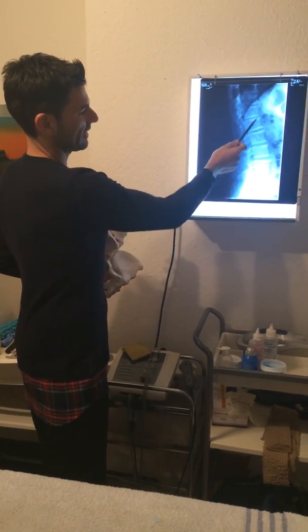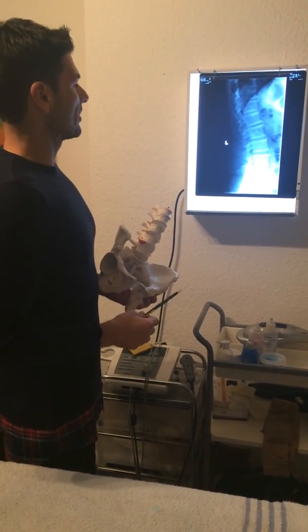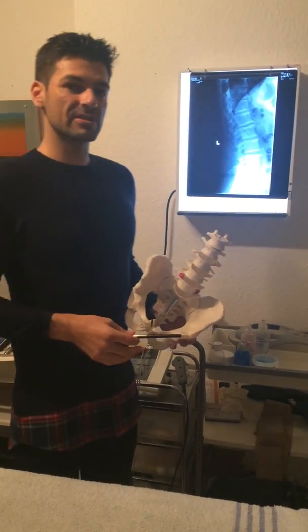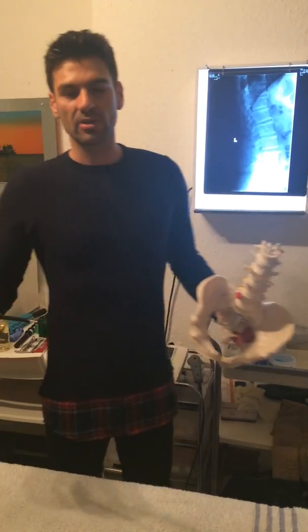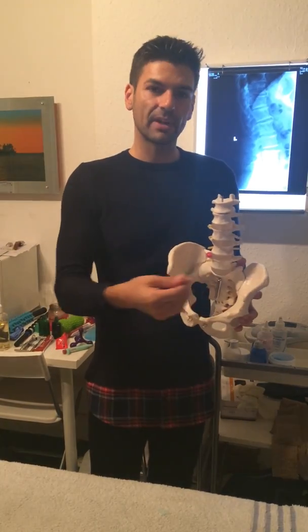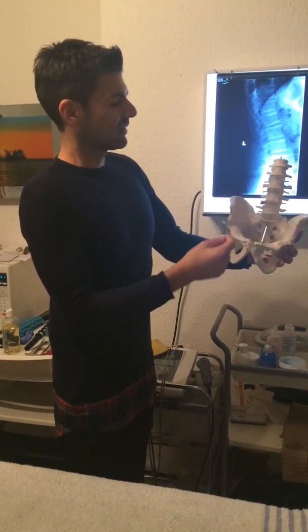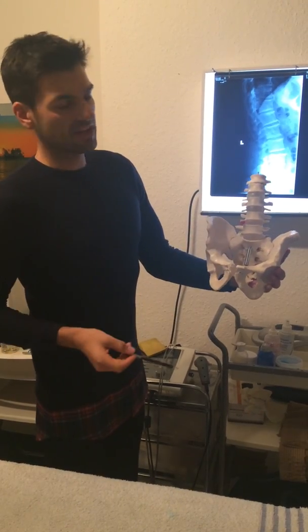tissue effect. So this is one of the standard x-rays that a chiropractor would ask to see in a set of films. We would always use ones at right angles, so we would most likely also have one from the AP, anterior posterior view, and when it comes to that, we would then look at the alignment again to see whether the pelvic structures are level.